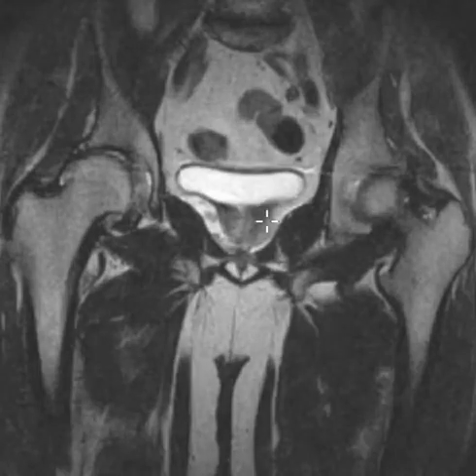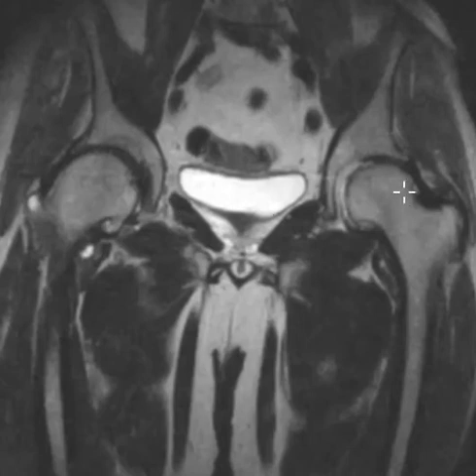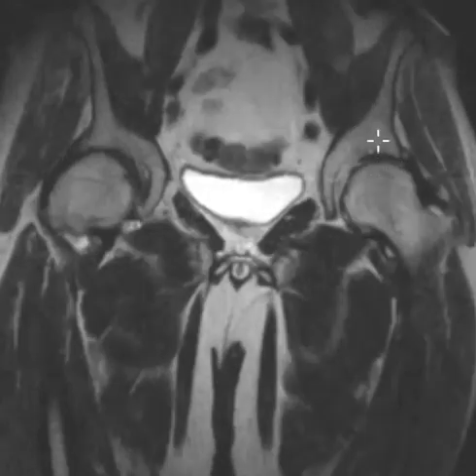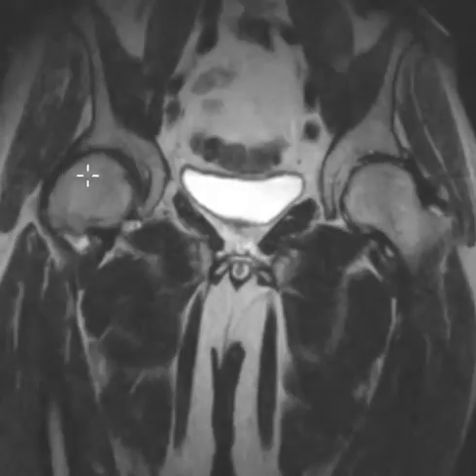We can see it on this view as well. This is a view where you can see the left femoral head nice and round, and here's the socket it sits in, the ball and socket. It looks nice and round, but over here you see this broadening, flattening out here. Instead of being rounded, it has a flat outer margin.